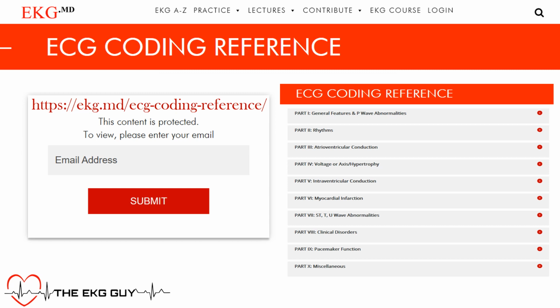So we are making our way through this EKG coding reference guide. We're all the way in part 6 here. We're looking at different types of myocardial infarctions, how to localize them. And in this lecture, we're going to look at acute lateral MI, and the findings we expect to find in that.